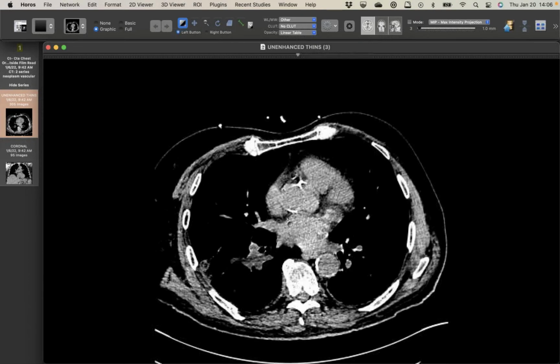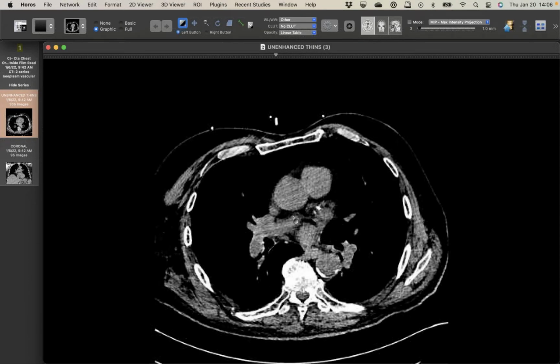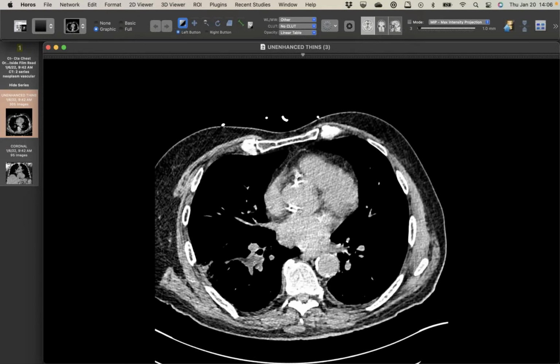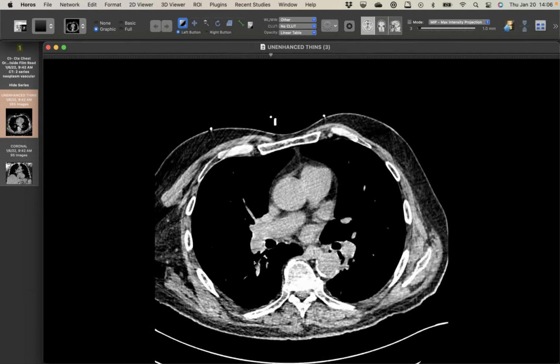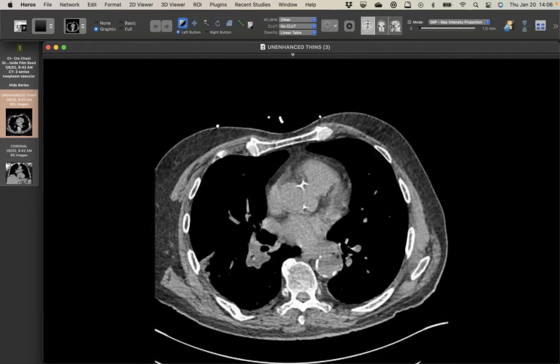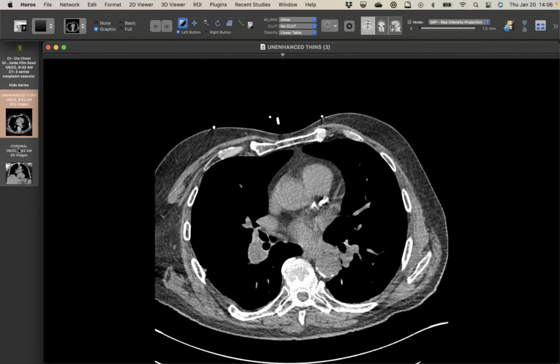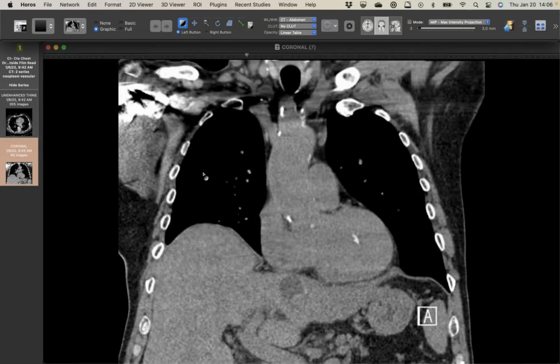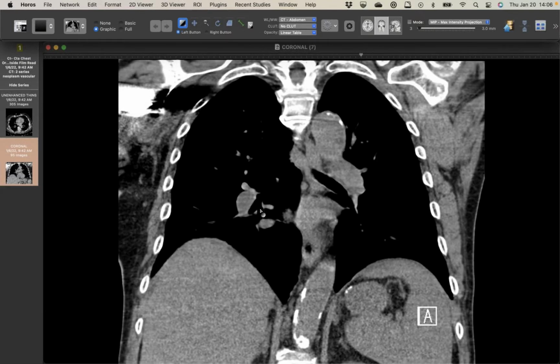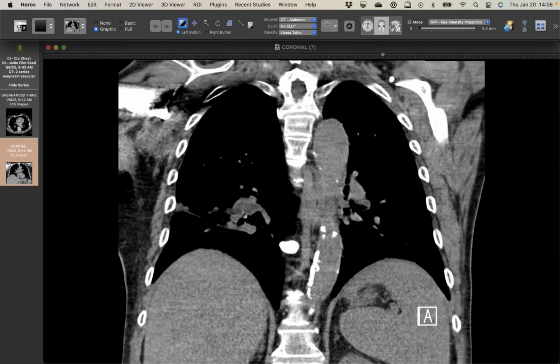And then if we go look at the lungs, we also see there's some expansion of these right lower lobe vessels. And right there, I'm just going to change the window a little bit. We see low attenuation. I suspect there's some in here as well. The coronal is a little less noisy. So hopefully I can convince you there is a filling defect in the pulmonary artery.